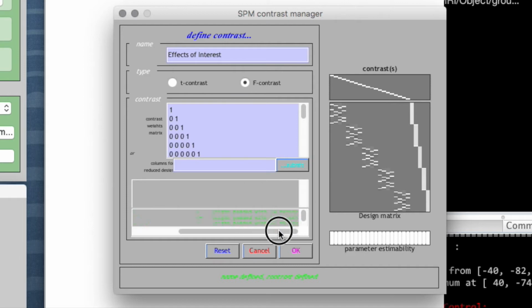Okay, so it's right padded with zeros, and we do have this weird looking line here because we've got just a 1 on there and the 0 and everything else. So for each of our interesting regressors, forget the constants and the other things SPM hides from us, for each of our 4 conditions for our 5 participants, so we have 20 lines with a 1 on each of the different contrasts on each of the different lines.